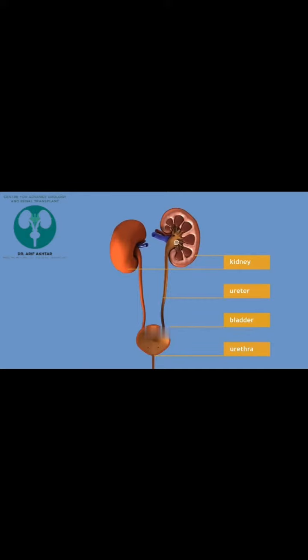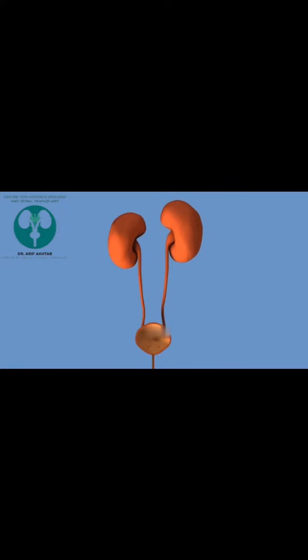Ureteroscopy is used to remove kidney or ureteric stones and enables a direct view of the ureter and kidney to confirm or rule out other abnormalities. This animation shows the removal of a kidney stone. Ureteroscopy is typically performed with the patient under general anaesthesia.